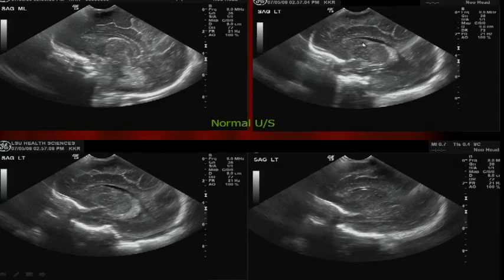So this is the choroid plexus going through the foramen of Monro. Here's the head of the caudate. Here's the thalamus. This is the caudothalamic notch. If you draw a line right here, nothing anterior here should be white in that black fluid because the choroid plexus would come here and then go back. It would not go forward. So if there's white in here, it's blood.